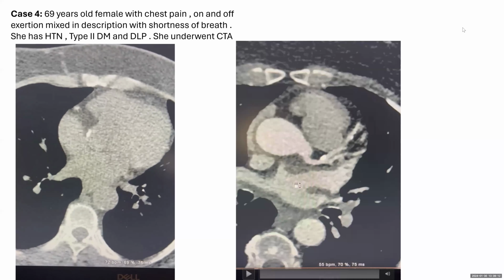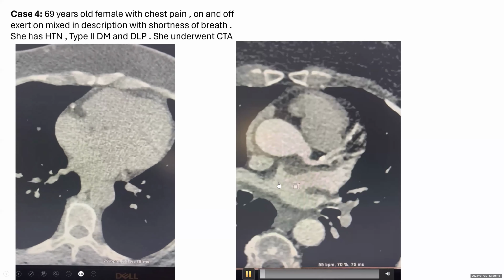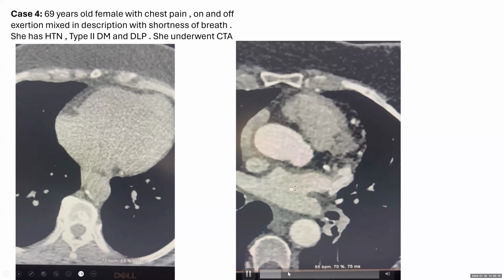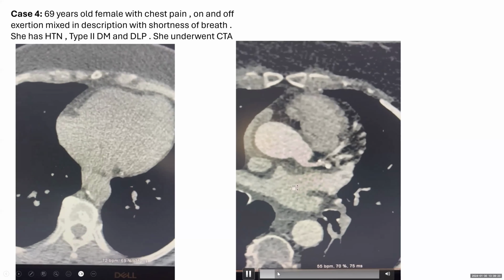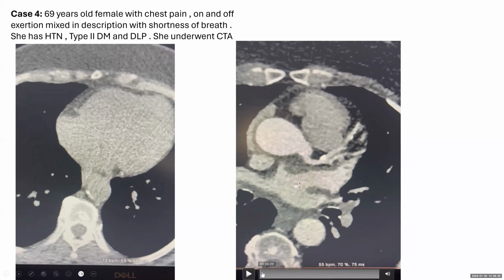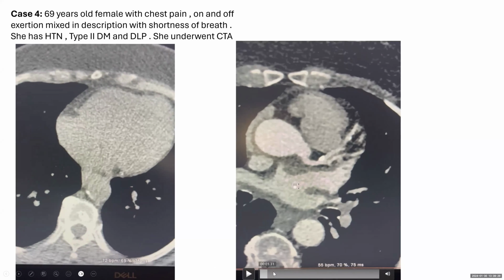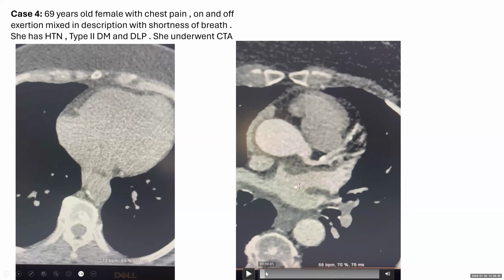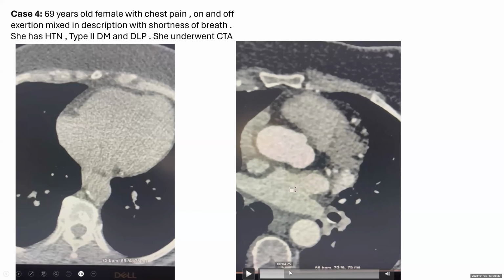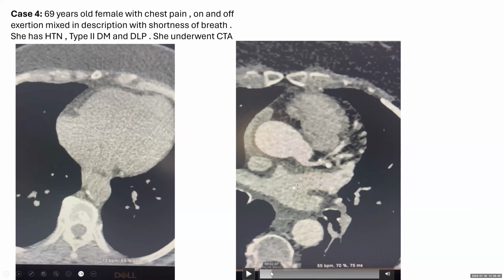Now looking into the CTA, which follows the coronary calcification, we can see the distal left main and the junction with the LAD. Here, you can see that there is a calcified plaque. There is a large ramus that has some calcification and plaque, which is not obstructive. And the origin of the LCX has a large calcified plaque, which deemed this segment non-evaluable, because the problem with calcification is that it gives you this blooming artifact or beam hardening, which was seen in the previous cases.